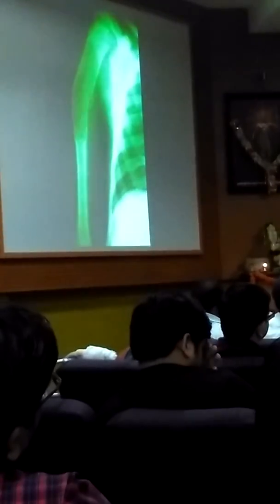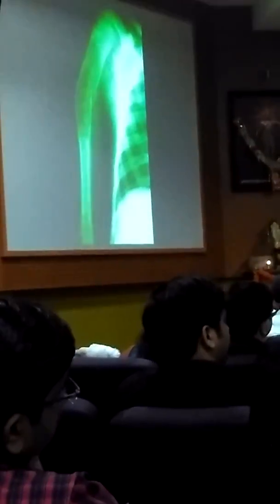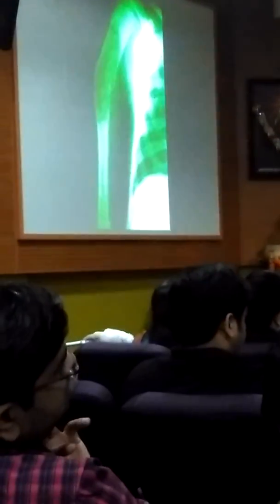If there is a noxious stimulus inside the bone, the process of destruction starts in the bone. And if it is occurring at a very, very slow pace, then the body has all the time to contain the onslaught of that tumor, and it can lay down barriers. If something suddenly arises and rapidly grows, the body is not able to contain the onslaught and the barriers are not very clean. So if you find very well defined margins in an osteolytic area, this will usually indicate that the process is benign. The more blurred the margin, the more malignant or aggressive the situation can be.